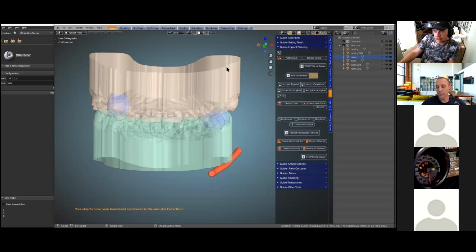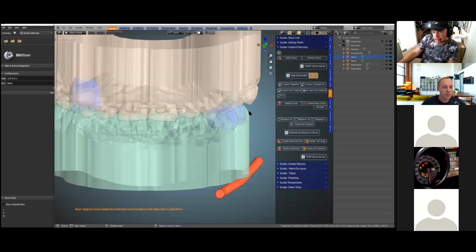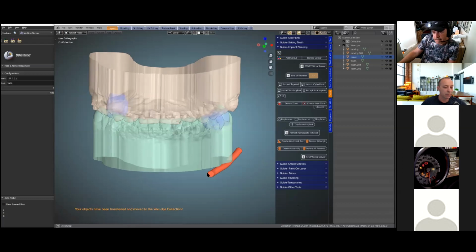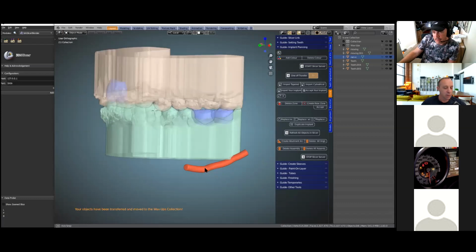Good. Okay, so does that complete the DICOM viewer bit? Oh no, of course we're going into the implant planning first now. So we're using Blender. Implant planning is two stage. We first put them into Blender for an initial placement, and then we fine tune in the DICOM editor.